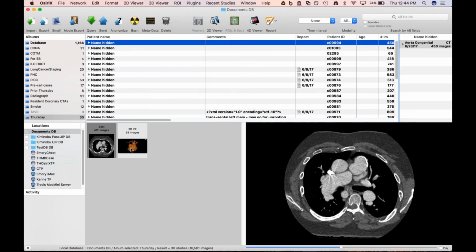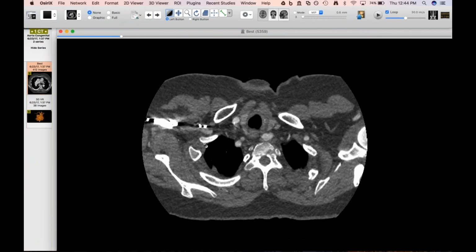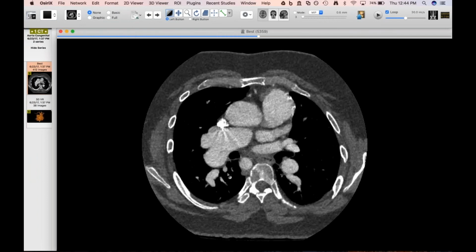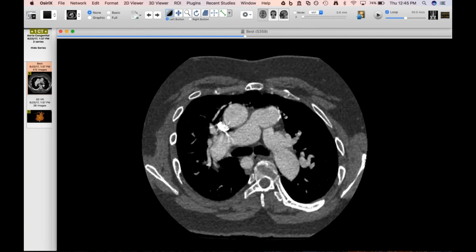Jeff, do you mind if I show this arch really quick? Go ahead. Okay. So I sent this out to some of you, and this was one from last week, and this is the weirdest arch I've ever seen, admittedly. Now, this is a patient with a TET repair, and this is just to assess their anatomy, kind of a checkup before they do a pulmonary artery or pulmonary valve replacement.